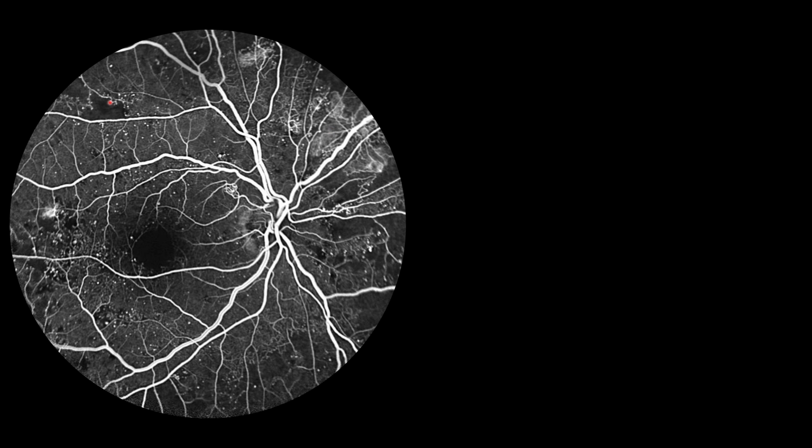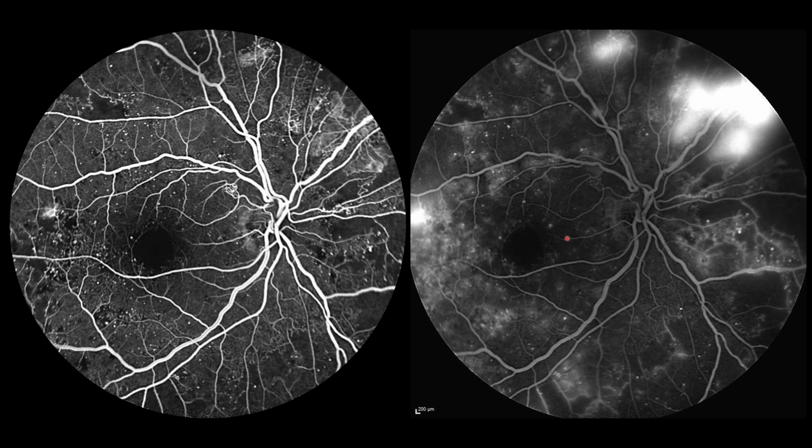Now, is this a blocked fluorescence or a vascular occlusion? For that, let us see a later image. So this is a later image of the same patient's eye. Now if you see, there are these few white dots which are still remaining exactly as they were before. They are still hyperfluorescent, and the area of the white dot has not increased. They have not enlarged. So this is what we call pooling, and these are microaneurysms. So the dye is getting pooled inside the microaneurysms.